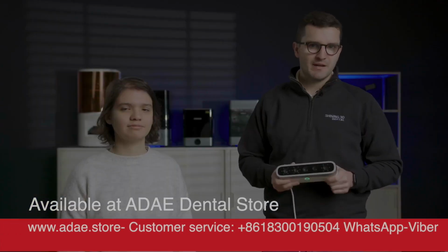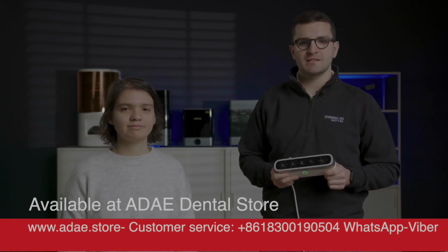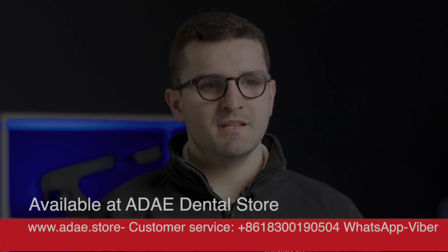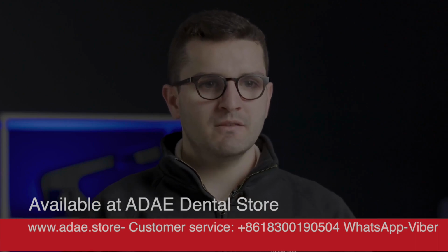I will be demonstrating the features and new functionalities of our new scanner, the MetiSmile. So let's dive in and see what this amazing product can do for you. Let's take a closer look at the software.